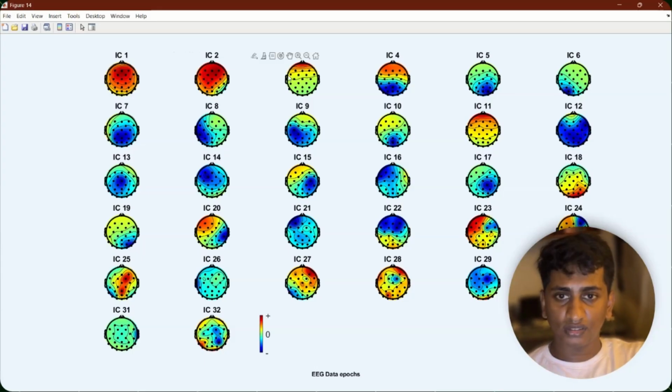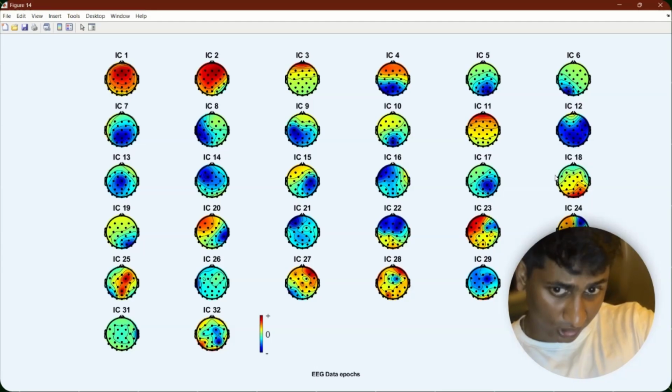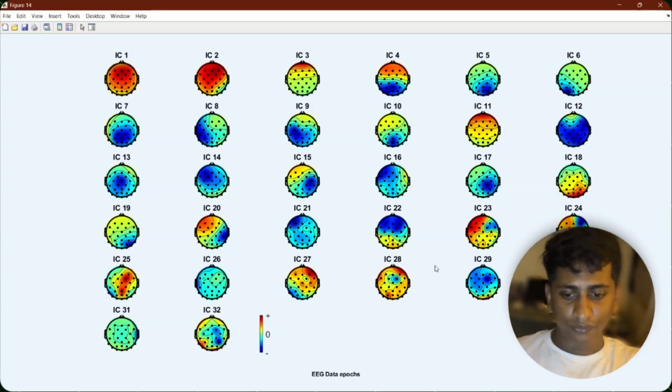I don't know if it's visible, but you can see the shifts of the signal at every node, and how it is at a specific time. In real time this will be a very beautiful image processing, if you see it all combined. Maybe we can do that another day.